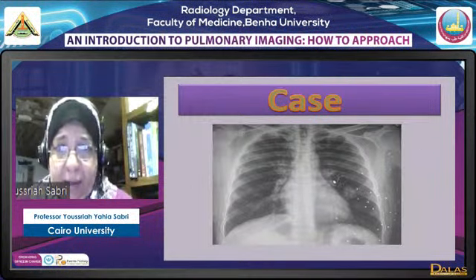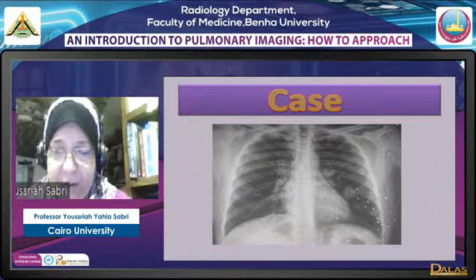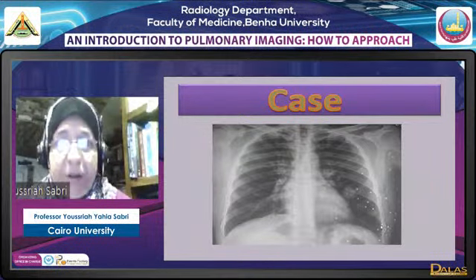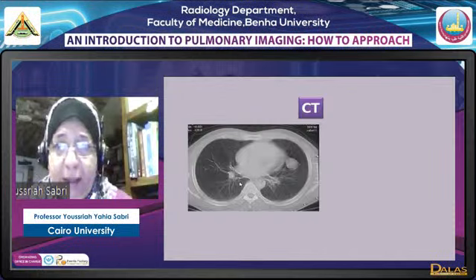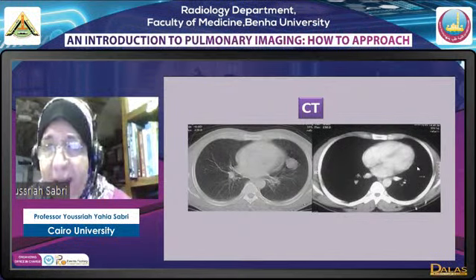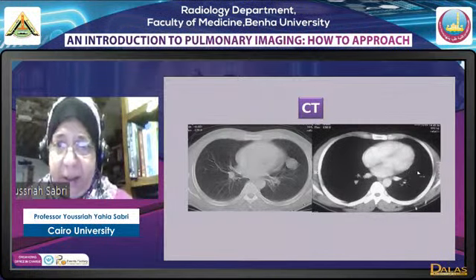In this case, young male patient, he was at a wedding and he got some gunshots, as you can see. He went to do an X-ray and an incidentalloma was present, a lesion that is incidentally discovered. He did a CT and the mass was seen in the lingula, in the lung window, while in the mediastinal window no lesion whatsoever was seen. So where did the lesion go? Simply, it's a fat density similar to this. Fat density, we are dealing with a lipoma of the lung, which is an extremely rare lesion.